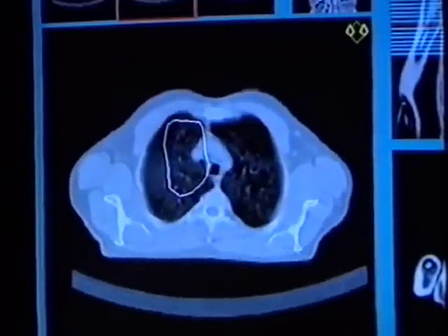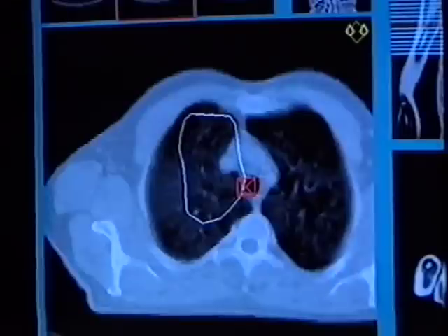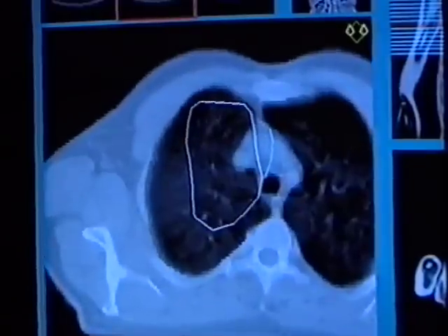The powerful zooming and panning function in TMS is another general tool that is easy to activate while drawing. Redrawing or modification of contours is quickly performed in any slice when inspecting the target volume.